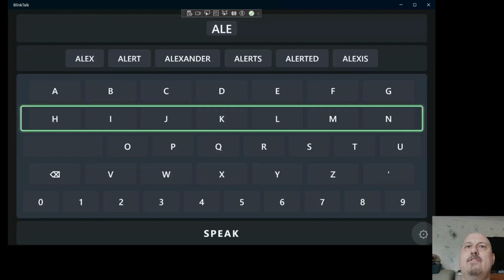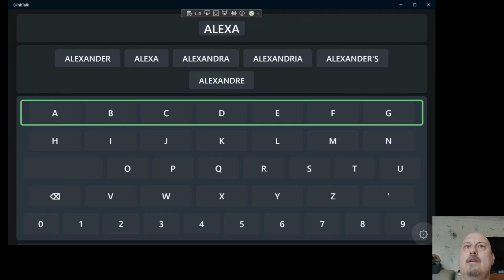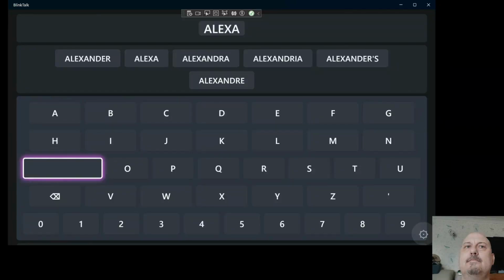Alexa. I haven't got an Alexa, by the way, so this isn't going to do anything. Alexa. And then I want that space that I've just missed.